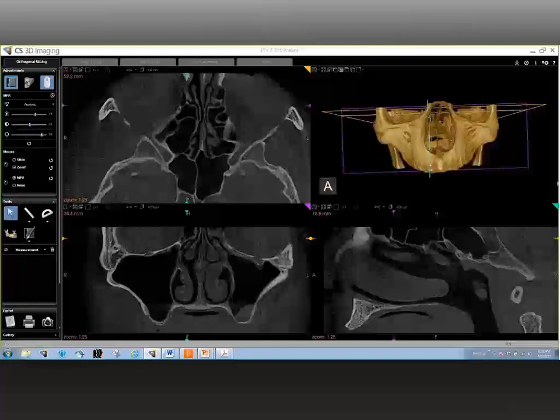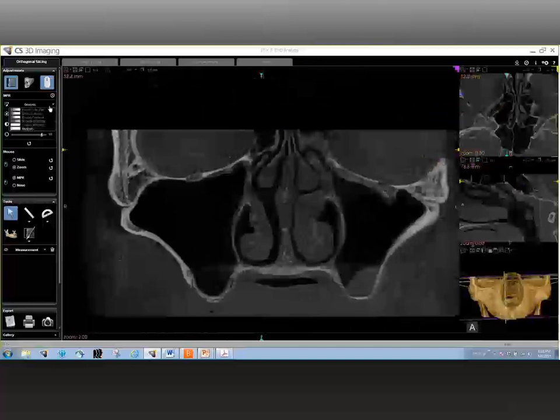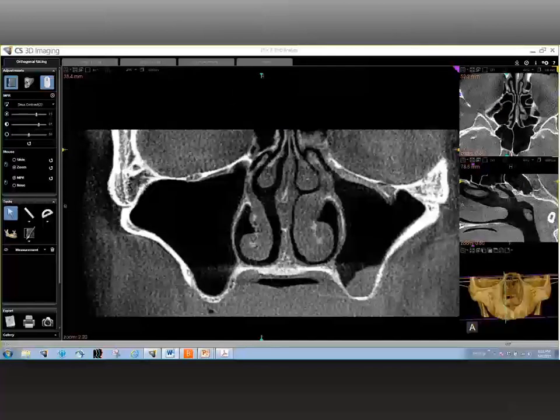What are the important anatomical landmarks of the maxillary sinus? One of the easiest ways to look at it, there are not a whole lot of landmarks to evaluate, but the ones that are there are very important. Firstly, when you look into the sinus, you see the floor of the sinus. The floor of the sinus is very simple to identify. It is nothing but the most inferior point of the sinus. And then you have the lateral wall of the sinus right there, the lateral wall. And then you have the roof of the sinus, which is the topmost extension, which also borders with the infraorbital rim, or the lower border of the orbits.